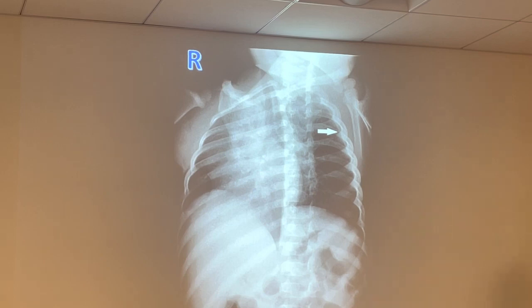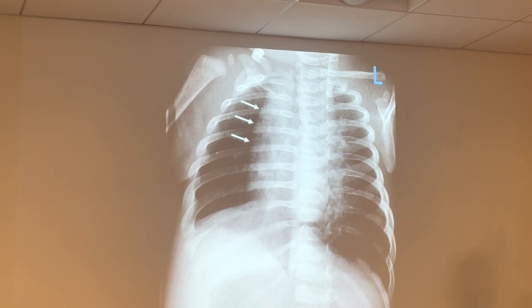Yeah. Yes. What about that one? Oh, I'm scared. Left side. You're supposed to do it on kids. LAO, to look at the right side. Look, we mark the side touching, the left side's touching, but what's elongated? The right. Therefore, it has to be LPO. What arm is lifted? The right. She made it so difficult. See? Making sense, guys? Yeah.